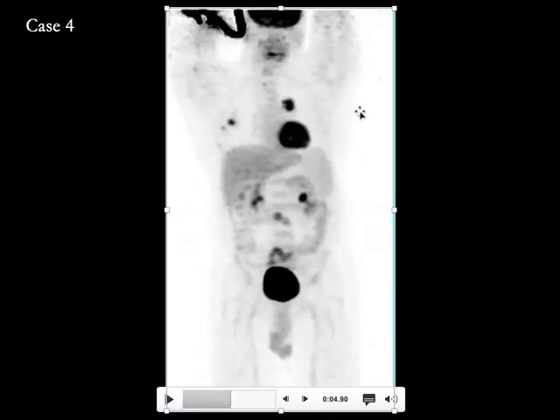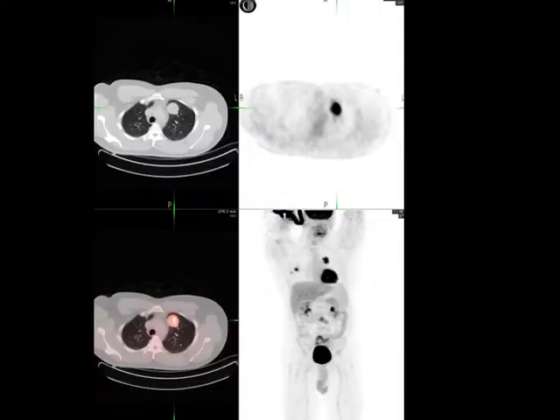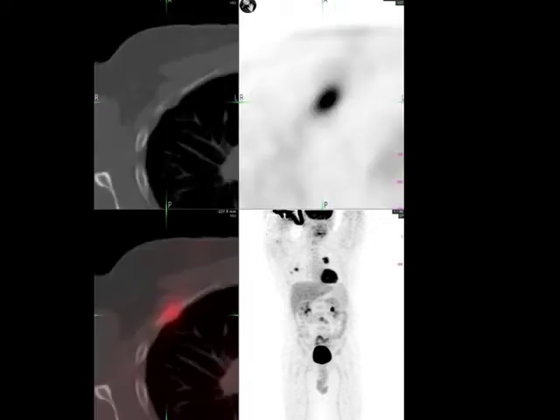Always when you are reading a PET scan of any kind, start with looking at the rotating image. Especially with FDG, it gives a good idea of whole body relative metabolism. So we see normal tissues and we see abnormal tissues, and we get a sense of how hypermetabolic those lesions are. So here is the primary lung cancer in the left upper lobe showing intense hypermetabolism, and here is the foci in the chest on the other side, which corresponds to a lytic bone metastasis in the rib, making it an unresectable stage 4 lung cancer.